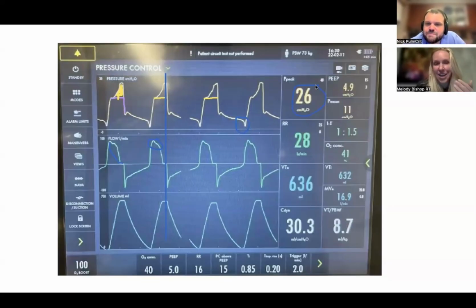This is telling you that without truly digging in and understanding the nuances of all of the problems with a patient actively working, or with modes of ventilation, you can end up having numbers that might look great on the surface. But then when you look at the waveforms, you can see profoundly that this patient is uncomfortable and that things are unsafe for this patient. So what would you do? What would be the first fix that you would try?